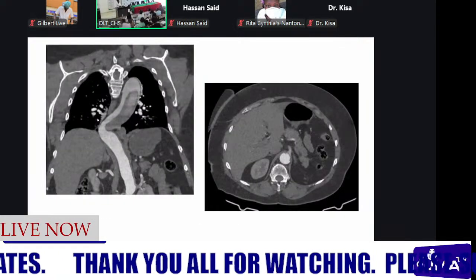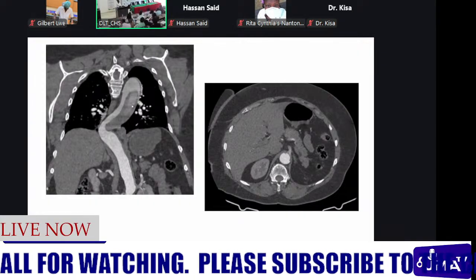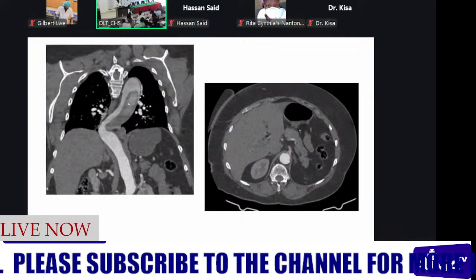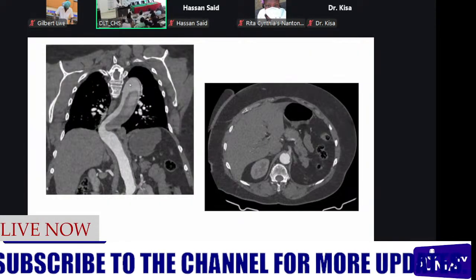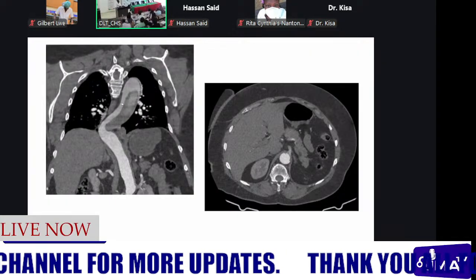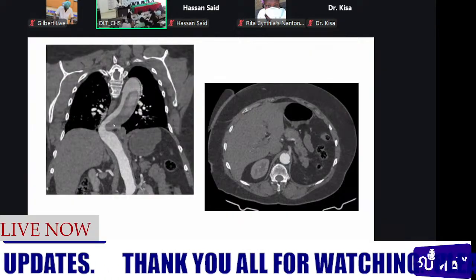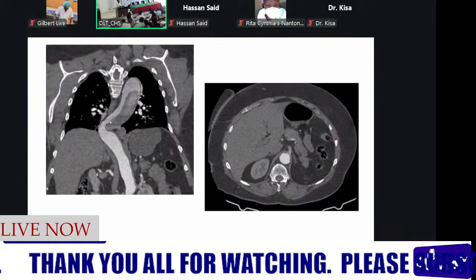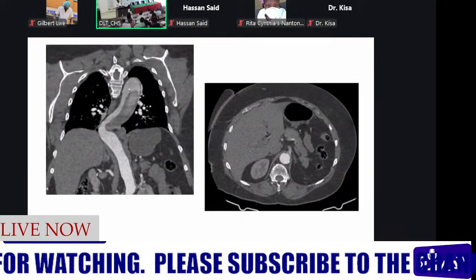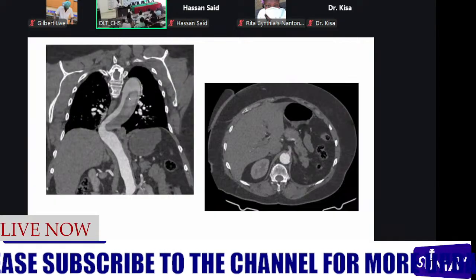Then in these other two images, we are at the level of the descending aorta now in coronal view. So we can appreciate still the false lumen, which has not yet enhanced, and our true lumen is enhanced, and there is actually significant compression of the true lumen at this point, which can explain the variation in the blood pressures that we were seeing. So the dissection continues, and also to note, the descending thoracic aorta was enlarged. It was measuring about 4.5 centimeters.